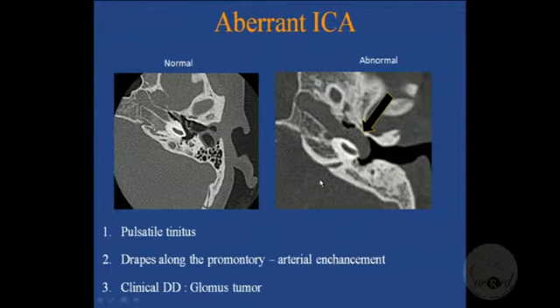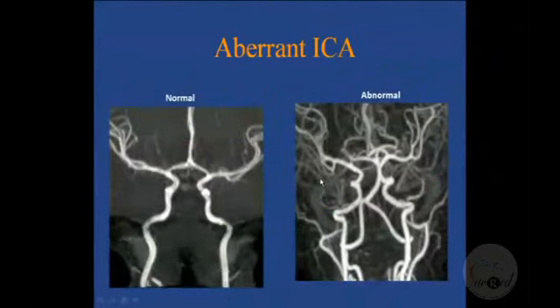And here is an MR angiogram. If I were not to provide this, and if I were to just give this image, say you did this angiogram for an aneurysm, this looks almost normal. Like you're looking for an aneurysm, with all these twists and turns of the ICA, you'll just miss this bump. So we don't want to have these two notches on the ICA. When you're looking through the ICA, this is the aberrant ICA, the lateral curve. That's the normal, and then it goes up. You don't want to have this too much. That's the abnormal. That's the aberrant ICA on an MR angiogram.